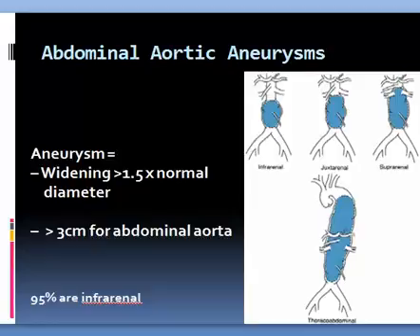Remember that the thoracic aorta caliber is 3.8 centimeters, does not exceed 4, and the relation between the thoracic and abdominal aorta is 1.5 to 1, while the relation between the ascending aorta and the descending aorta is in the range of 5 to 4. The descending aorta should be less than the ascending aorta.